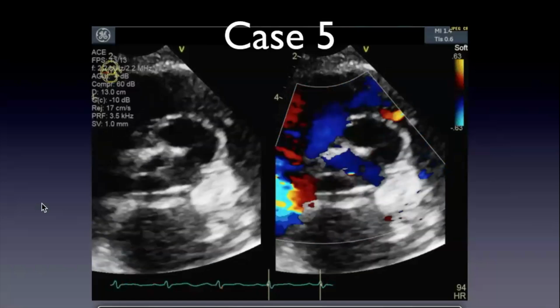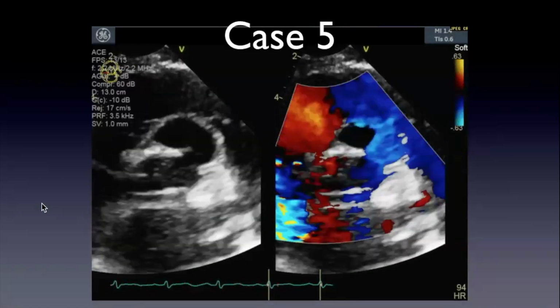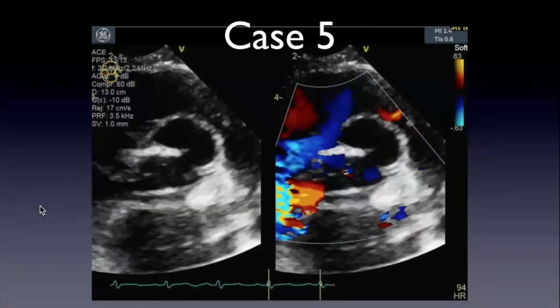So based on this, do you think there's a bit of systolic expansion? So maybe it's a leak, there's motion. You don't see any color Doppler, so we're not sure if there's a leak. So do you think there's a leak? You don't know. Okay. Hard to tell.